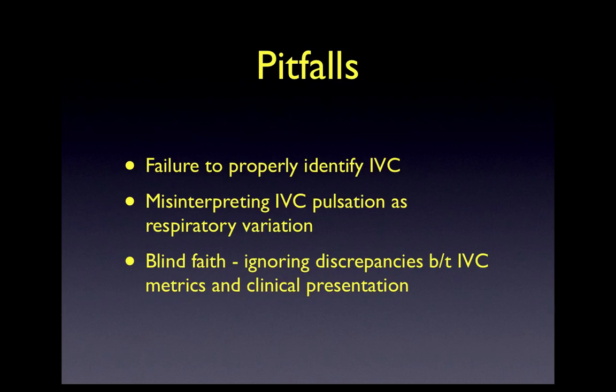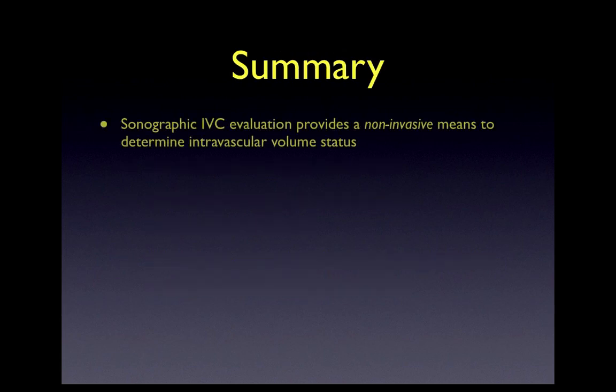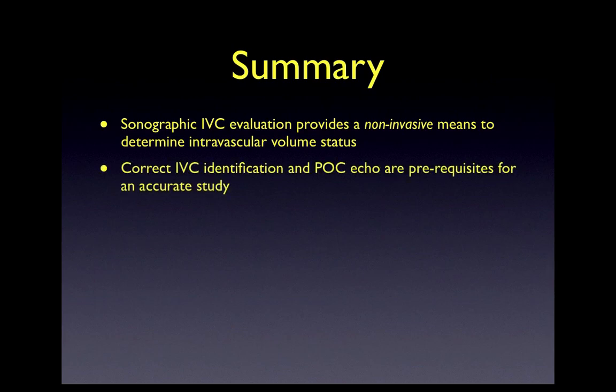Blind faith in any test, including ultrasound, can be quite dangerous and has the potential to do more harm than good. So in summary, sonographic IVC evaluation provides a non-invasive means to determine intravascular volume status, and it can be done several times in the same patient, both at the index evaluation as well as following therapeutic interventions. Correct IVC identification and point-of-care echo are prerequisites for an accurate study.